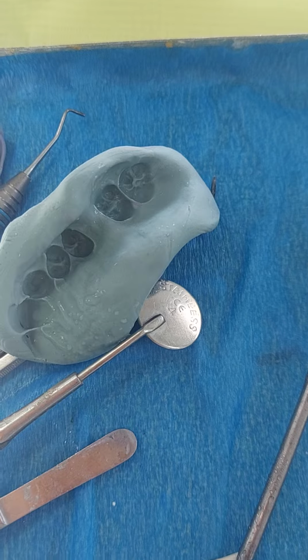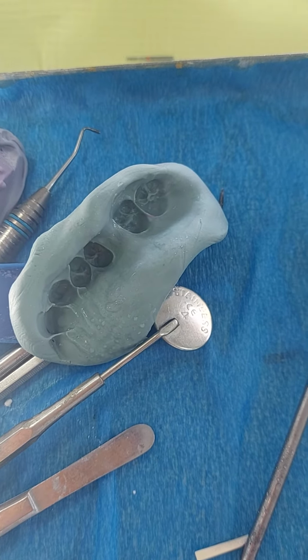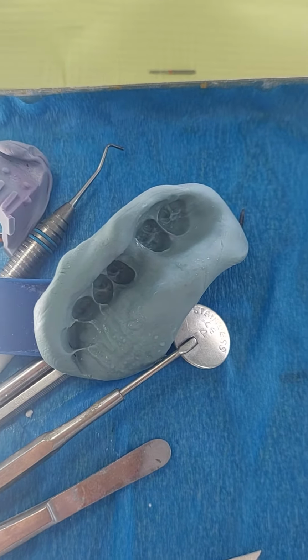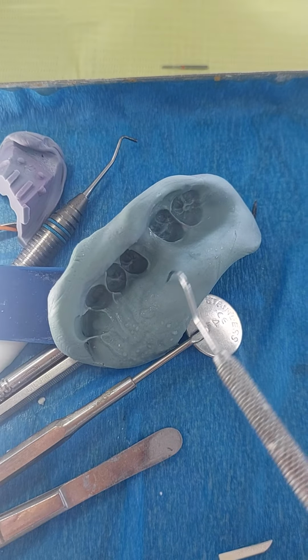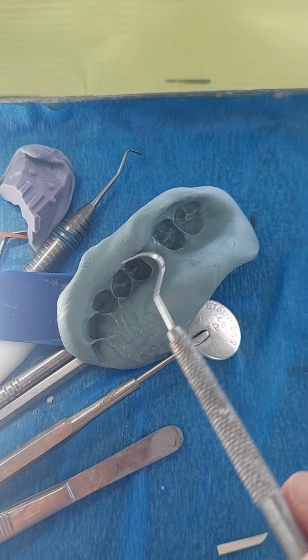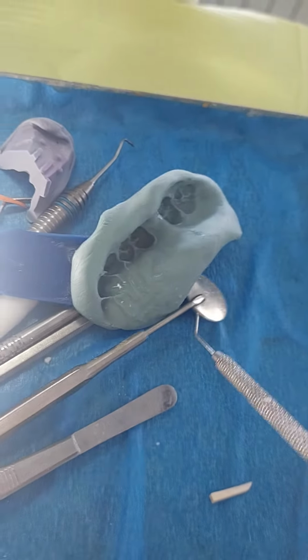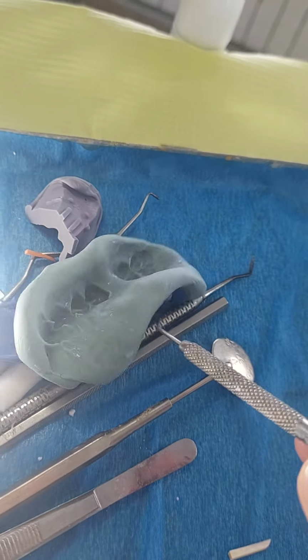Now, what interferes with the seating? Let's see the index. So, this is the case of the index. The index is beautifully performed in terms of intraoral impression. But notice, do you see all of this excess? This will interfere with the seating. And you said the patient has a limited mouth opening. So why put all of this bulk as an index material into the patient's mouth?